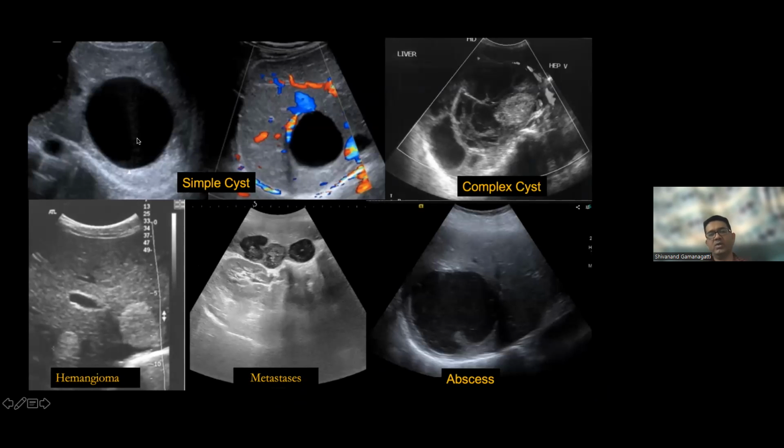Mainly whenever you have a focal lesion or a patient has come for the evaluation of any non-specific right upper quadrant pain, you pick up a lesion and you have to characterize it, and ultrasound is the best modality. It will characterize mainly into solid and cystic. This is the anechoic lesion with imperceptible wall, not showing any vascularity. The vessels are displaced. The characteristic feature of a simple cyst. No further imaging is needed. The diagnosis is very certain.